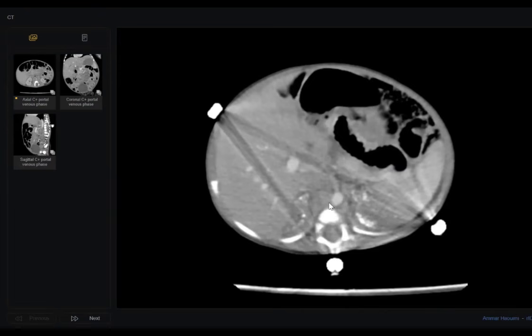Okay, so calcified bilateral adrenal glands. These could be due to hemorrhage, prior hemorrhage, hematoma, or tuberculosis infection. What else? There is one syndrome with bilateral adrenal gland calcification. I couldn't recall the name.